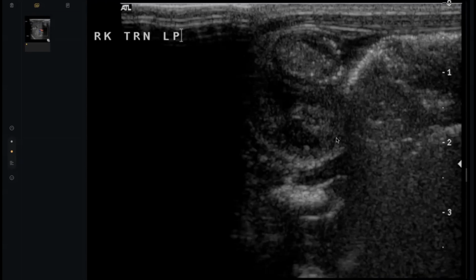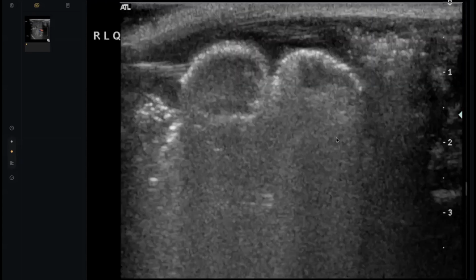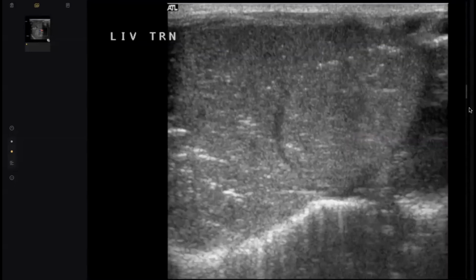There is another image focused on the liver. There are multiple echogenic sheets of hyperechogenicity, likely air inside the liver. I will ask if the patient is premature, less than 32 weeks. Maybe this is necrotizing enterocolitis associated with portal vein gas.